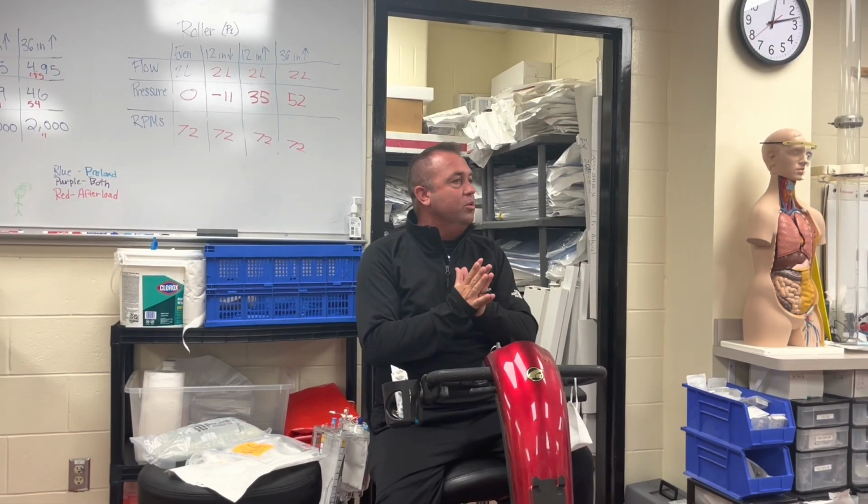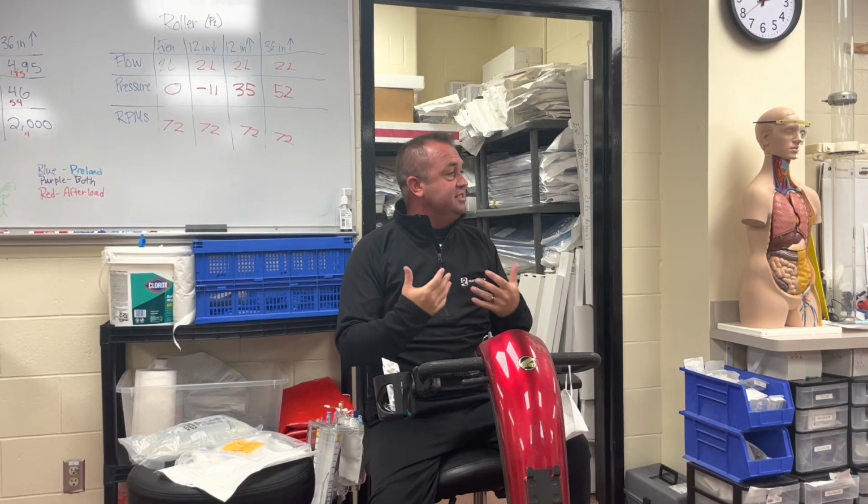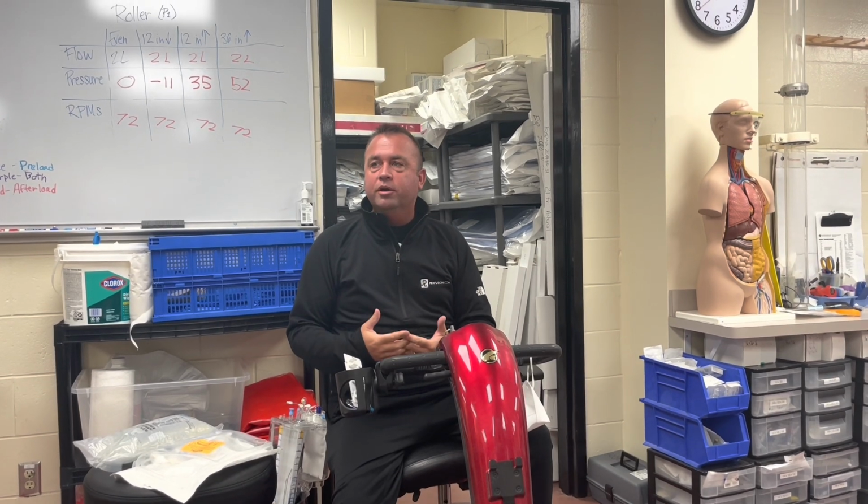So this morning we are doing pressure diagnostics, pressure assessment, and pressure dynamics. The goal of this is to teach you how we monitor pressure.